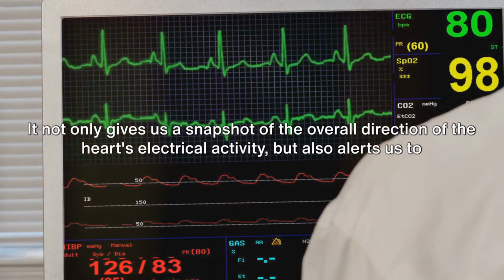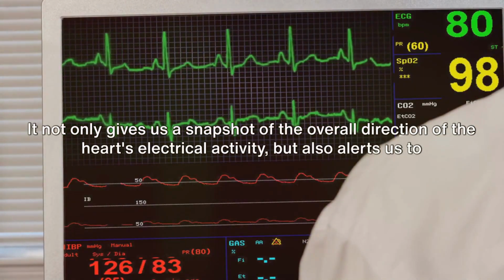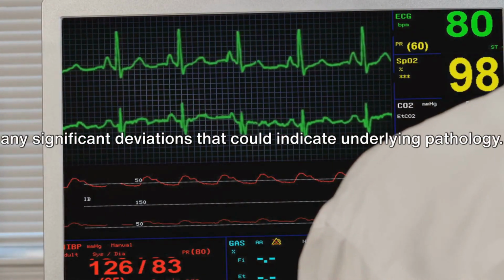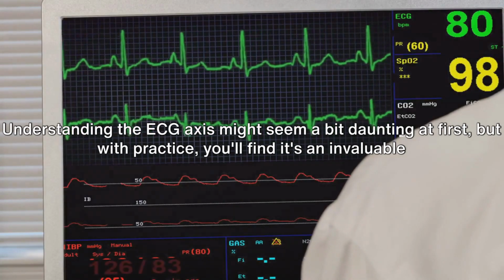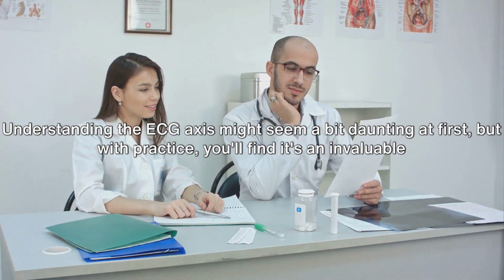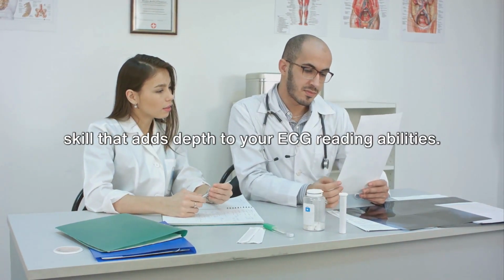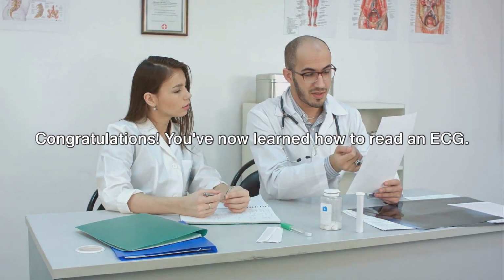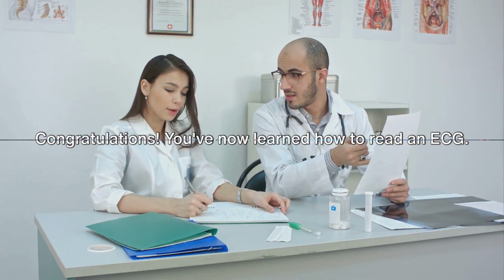It not only gives us a snapshot of the overall direction of the heart's electrical activity, but also alerts us to any significant deviations that could indicate underlying pathology. Understanding the ECG axis might seem a bit daunting at first, but with practice, you'll find it's an invaluable skill that adds depth to your ECG reading abilities. Congratulations, you've now learned how to read an ECG.